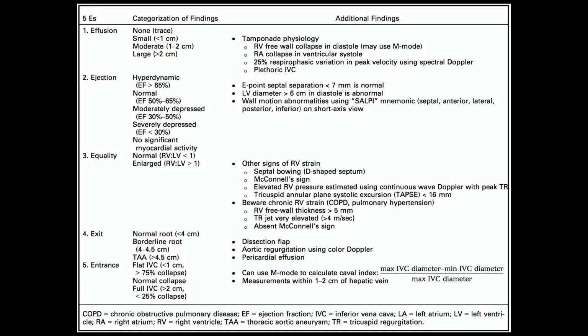We can use some overlapping terminology, but really those are the subcategories of depressed. And then obviously, is there no cardiac activity? We can use a couple of different metrics for evaluating that. So the global gestalt, the E-point septal separation, fractional shortening, and various other metrics. We've talked about these a little bit on this forum in the past.